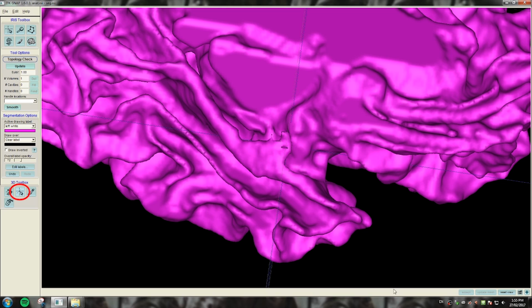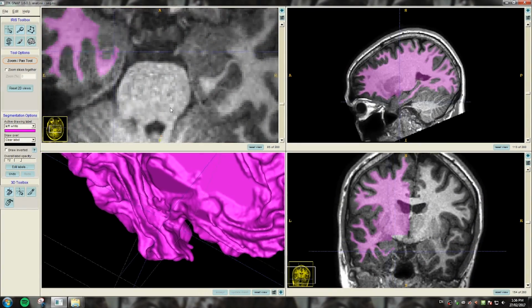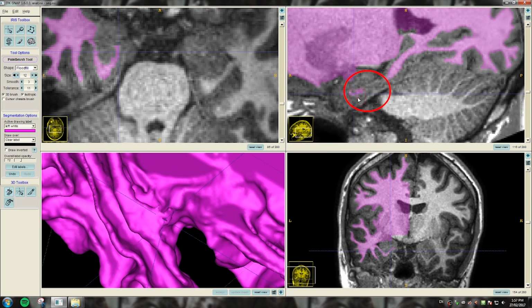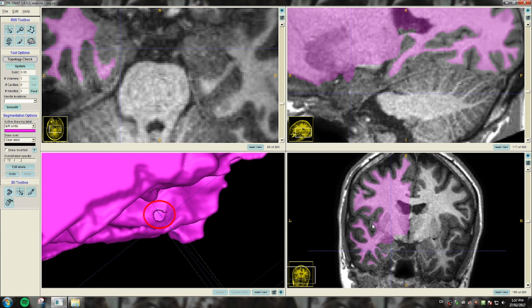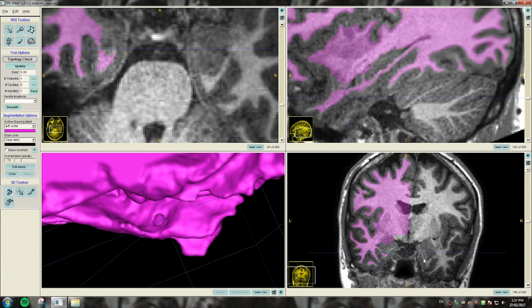So to actually get it to the exact location of the hole, you have to scroll through using the 3 views to get the crosshair in the middle of the hole. So as you can see, it was actually caused by an extraneous part being filled in. So I've erased this part, and now you'll see that there's another hole that we have to fix. Sometimes that happens when you erase something trying to fix another thing, then that stuffs up something else. So you'll just have to find the coordinates of this particular location and then fill it in.